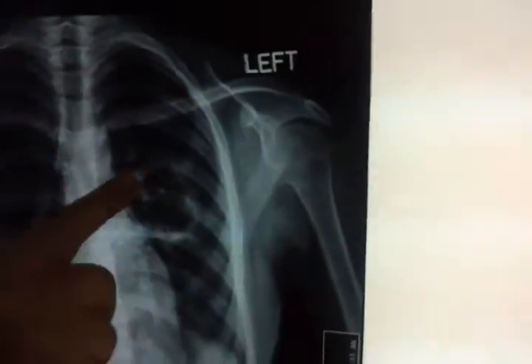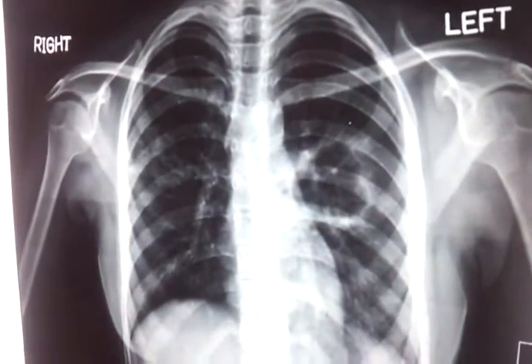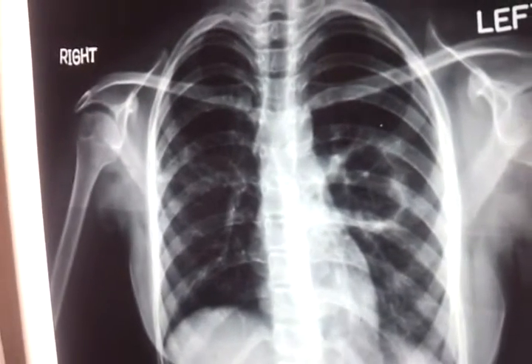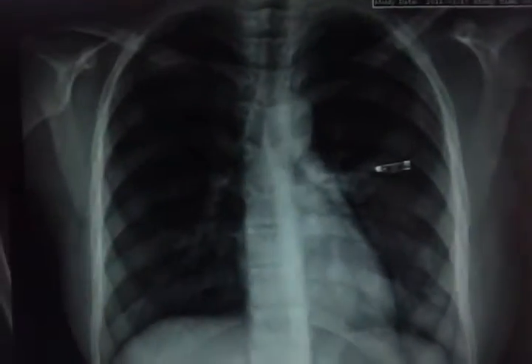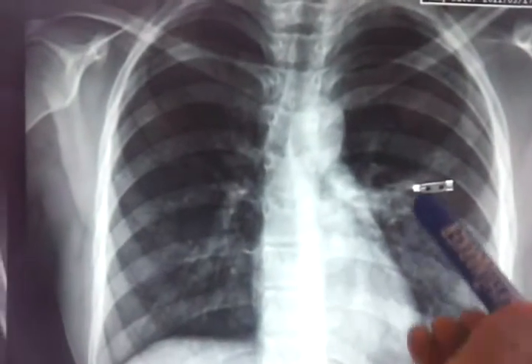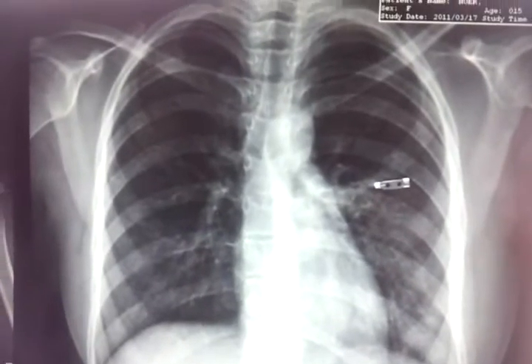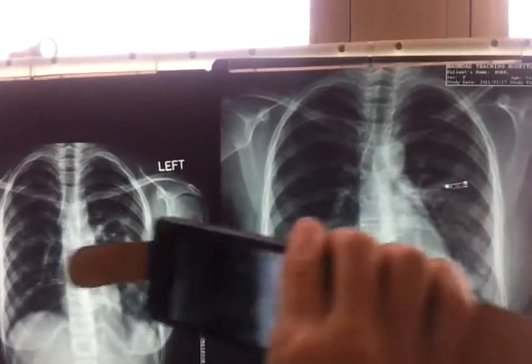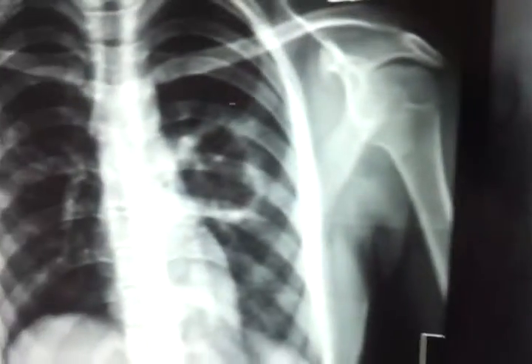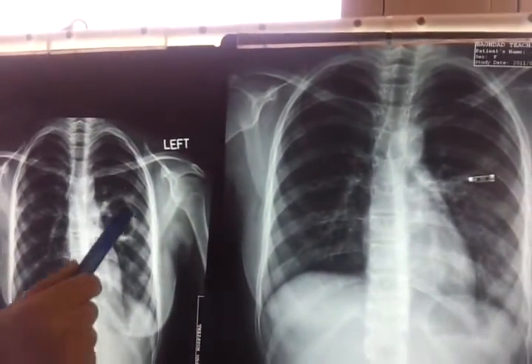This patient's sputum was positive for AFB. We started her on anti-TB treatment for 6 months, and this is the result of our treatment. Dramatic response of the cavity, nearly disappeared. TB cavity, and the patient's health returned to normal. We call this post-primary tuberculosis.